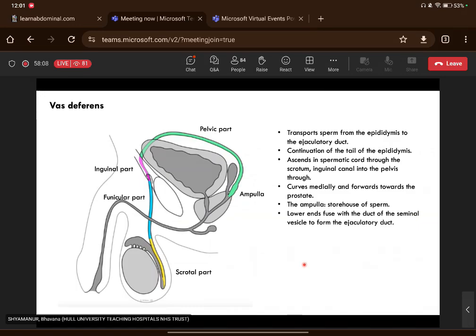How can you tell the difference between a male and a female pelvis on an axial CT? I agree, it can be tricky. Of course, a sagittal makes it much more straightforward, so does a coronal, but sometimes if you do have an isolated axial slice just through the lower pelvis, it can be hard. As Tim said, one of the ways to do it is have a look at the shape.